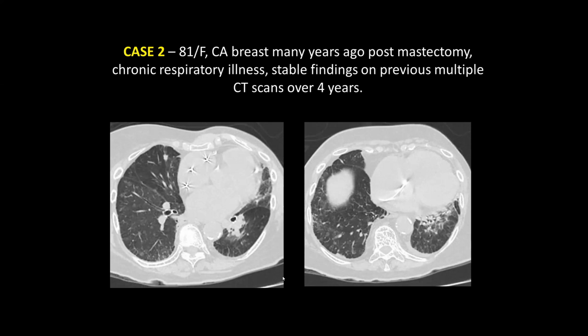What is your finding and what can it be due to? Yeah, just look at the right lung findings. Or specifically, you could look at the right lower lobe findings and tell me what you think those could be. Right lower lobe.